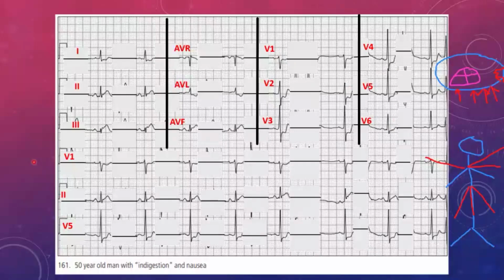Now, whatever else is happening in the ECG, great, that's there. But we've also got a bradycardia and we've got this infarct. So this means we need to start treating this patient. The reason for the bradycardia is the infarction. The patient has damage to the conduction tissue as well as to the muscle. So this is why the patient is in bradycardia.